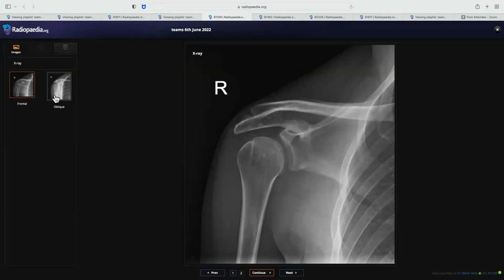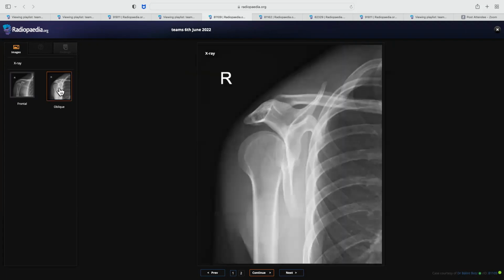And then you can say something like, I'm not able to appreciate any distinct sign based on this radiogram. However, in my routine practice, I would get an orthogonal view to rule out dislocation. And this was a Y view, which you do for shoulder. There's a posterior dislocation which is very well seen.